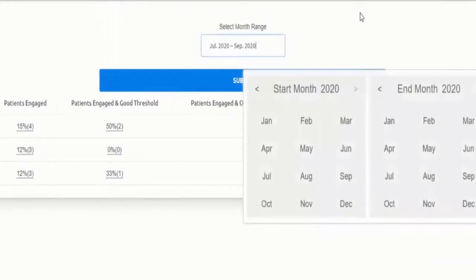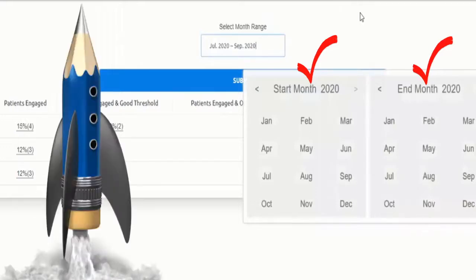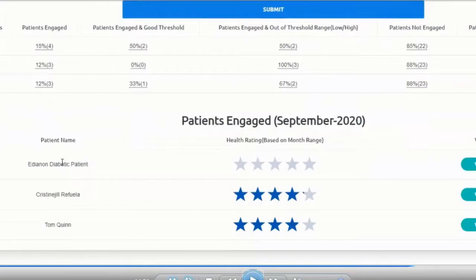The report analyzed by outcome will provide you with a statistical view of where your population stands based on American Diabetes Association's and American Heart Association's guidelines. You simply add your date range, reading type, and sub-reading type, and now you have real-time access to where your population stands overall and individually, with the option to visit the patient profile and launch a patient monitoring session.